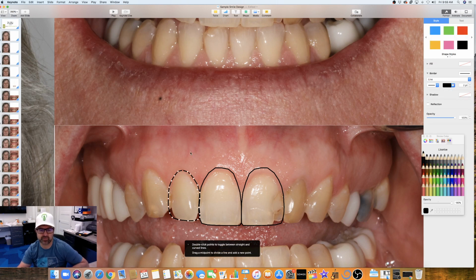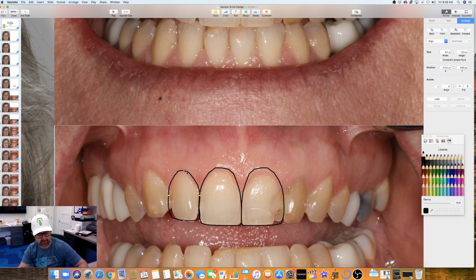You can play however you want. Some people have templates they use. I like to just draw my own. It gives me, I don't know, feels like more control over that. And there you go. Now you have, and these lines will help you line them up symmetrically.